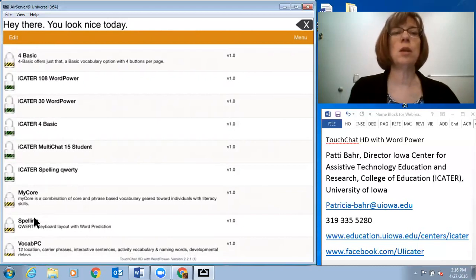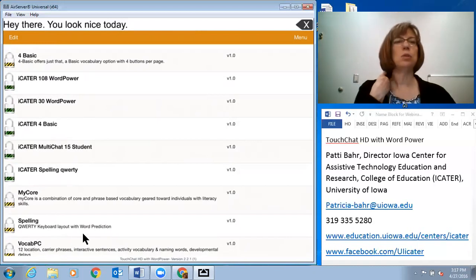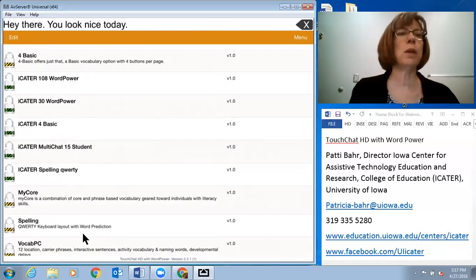So these you can never modify. But these, I've made a copy and I've renamed them so I can modify those, and I've still got my original, which I think is a really smart way to keep your information kind of pure, if you will.